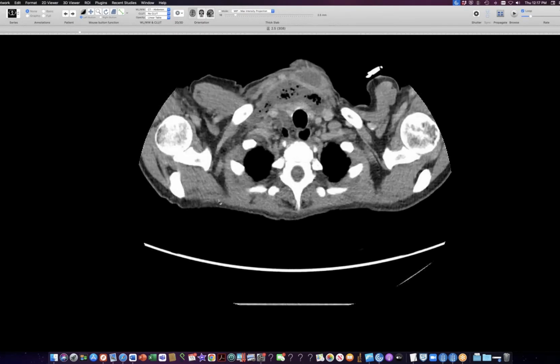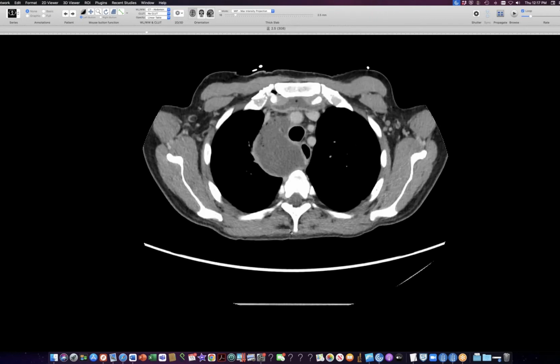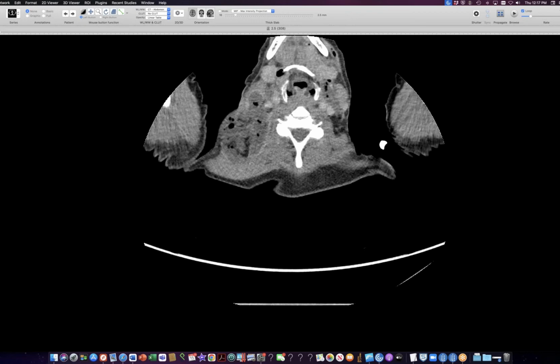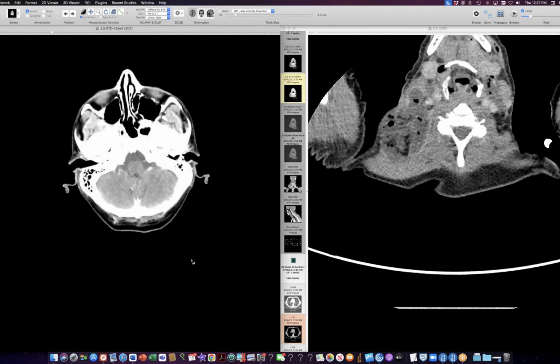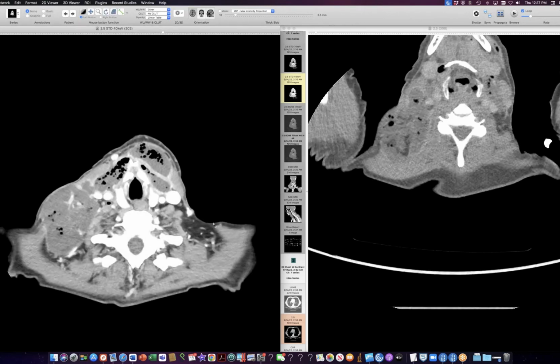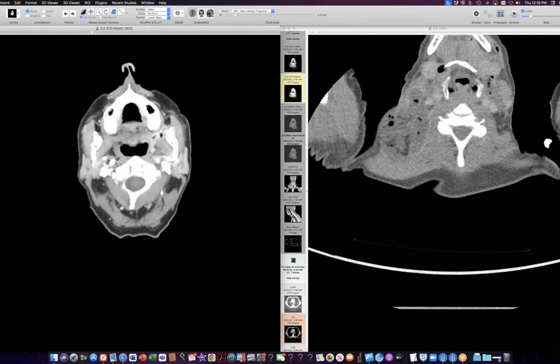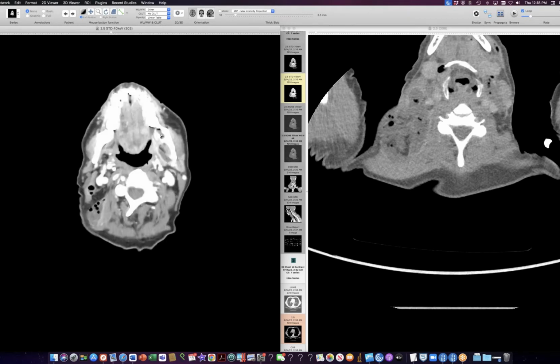Here is what's going on in this person. This is a mediastinal abscess, but the mediastinal abscess that contains some gas is way extensive, goes way up into the neck. And let me show you on this neck CT. Can you see this neck CT on split screen, guys? Yeah. Okay. So here it is going way up into the neck, and it arises from the site of extraction of a lower molar here in the jaw.